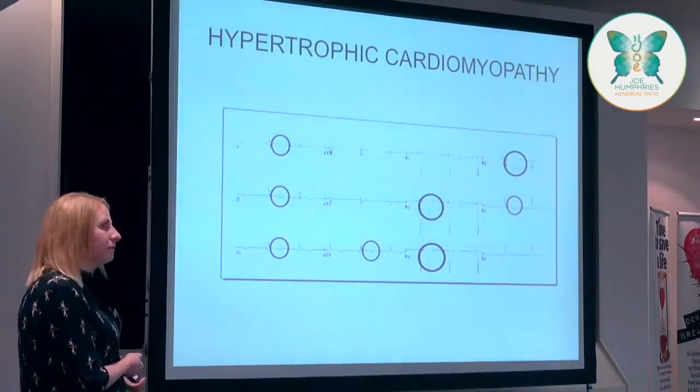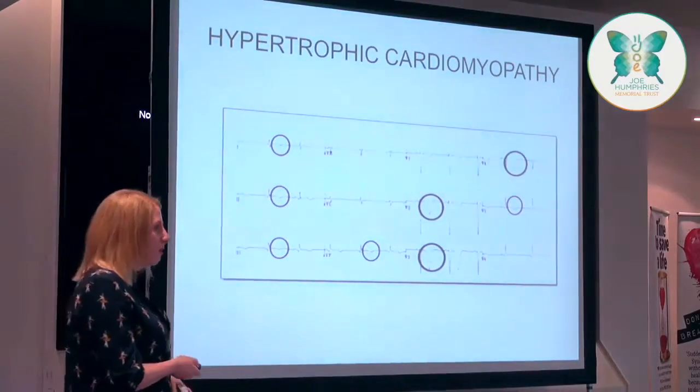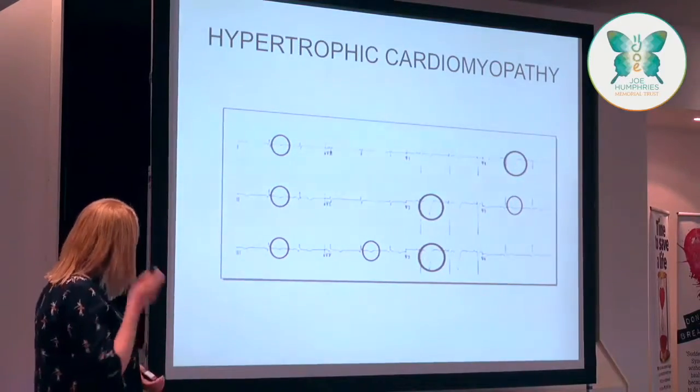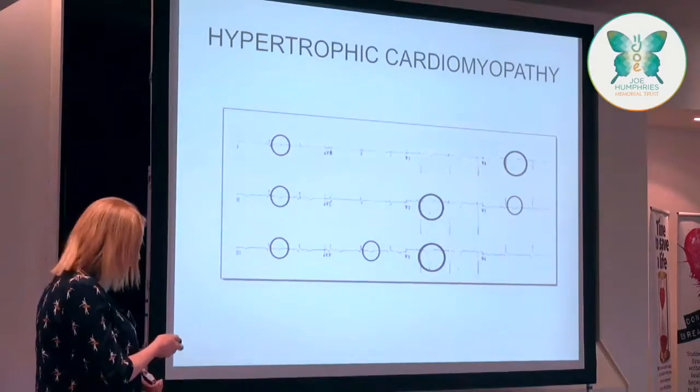And what it's showing is ECG changes, so this is not a normal ECG. So people who are seeing this, medical professionals, nurses like myself, we were thinking that there must be something causing this. Obviously that needs further investigations.